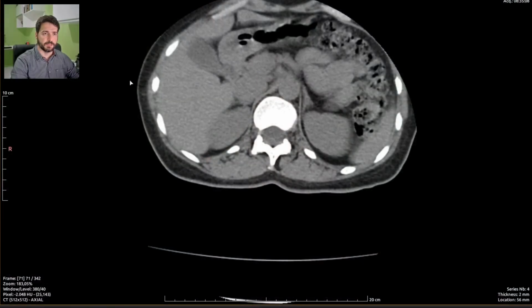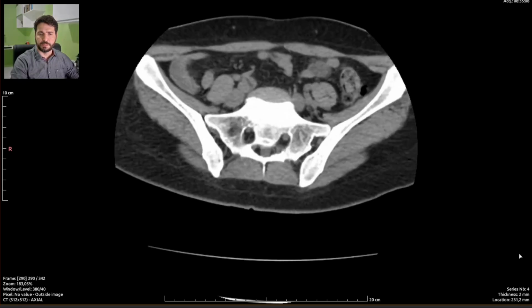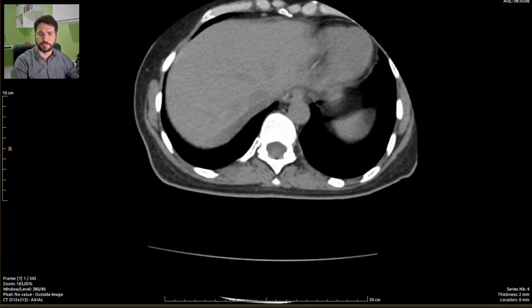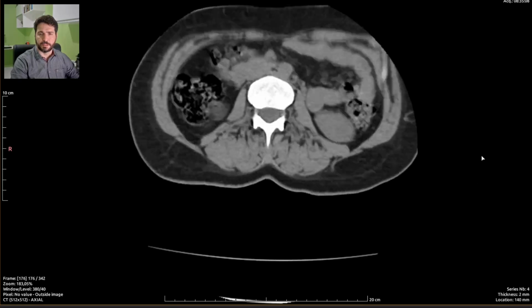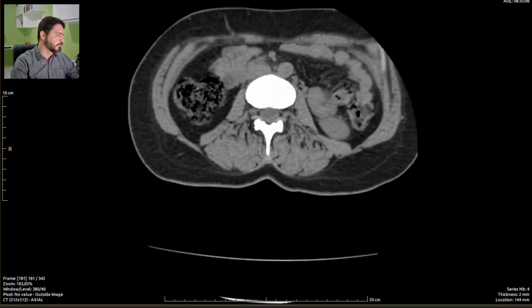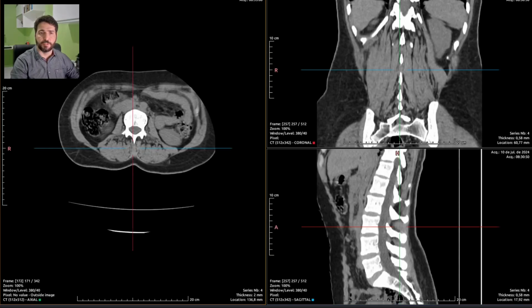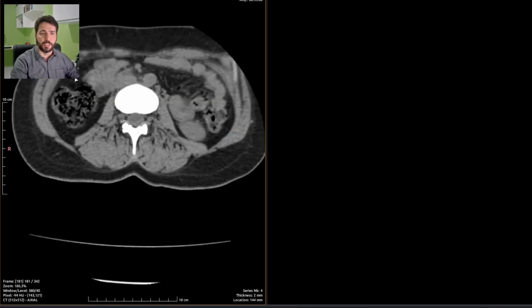This is supposed to be a lumbar spine, but it's really badly done. This is the wrong field of view, and this exam is all shaky and really low quality, but it is what it is. Let's see. It says she has lower back pain, so let's see if we can find a cause, a justification, a motive for such pain.